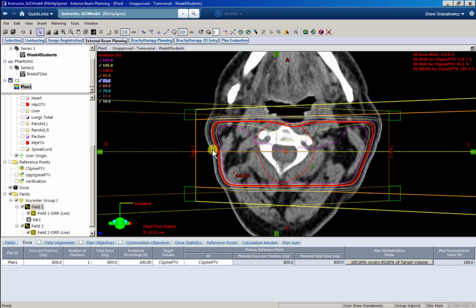Okay, so right away you notice that that superficial dose went up, our hotspot went up. Again, it's taking more MU to deliver dose as deep as our target. And it's a little bit hard to tell, but that penumbra also does go down. So it was a half cm, now it's 3 to 4 millimeters, something like that.